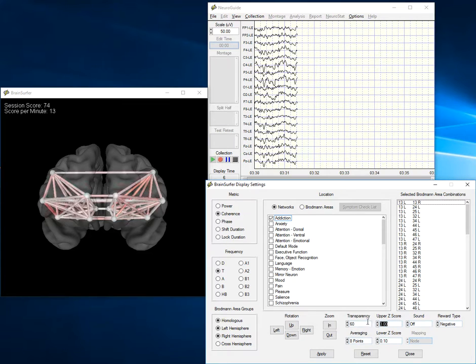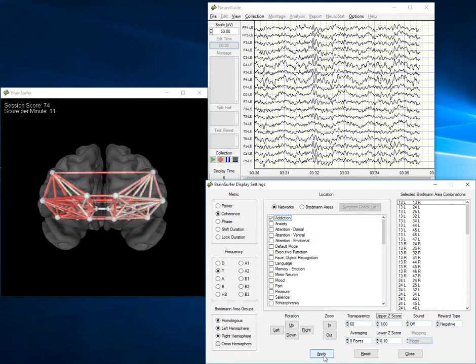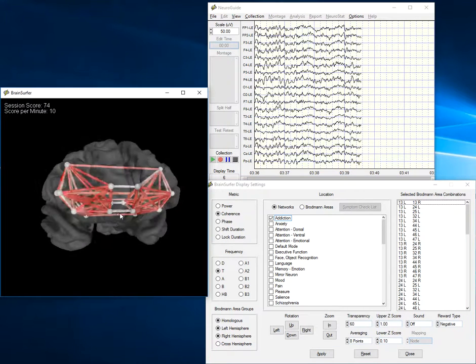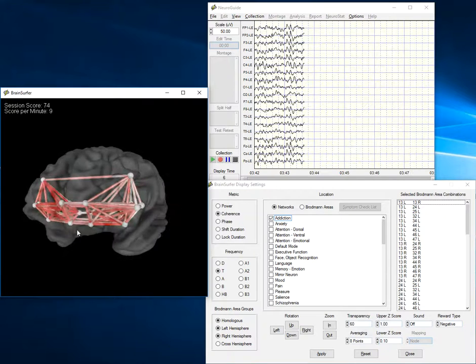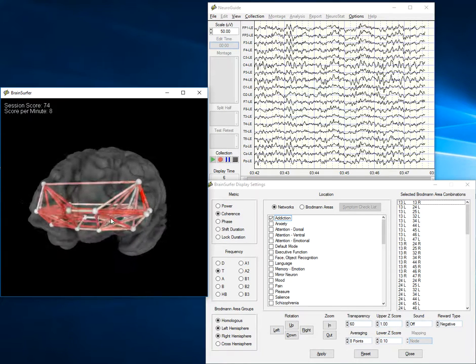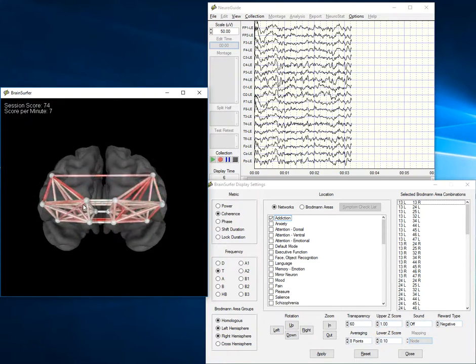This is the kind of view you see when a patient is substance abuse critical, in which they have strong craving and the addiction network is hyperactive. And then the idea is to quiet this network down to minimize and reduce the cravings.